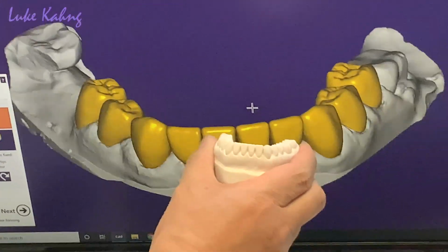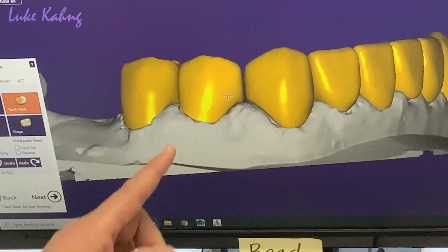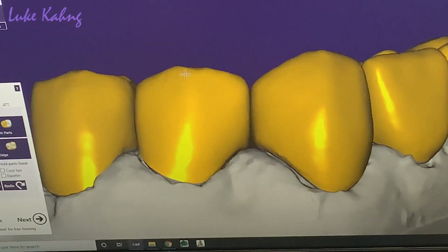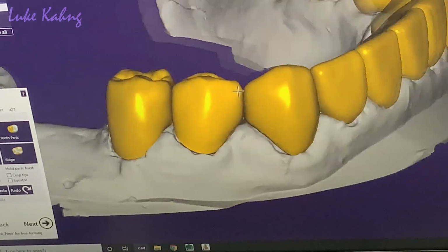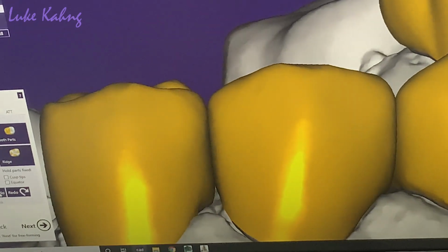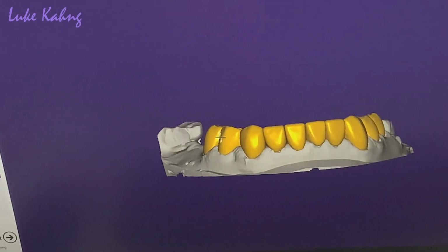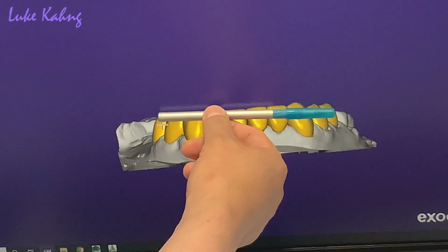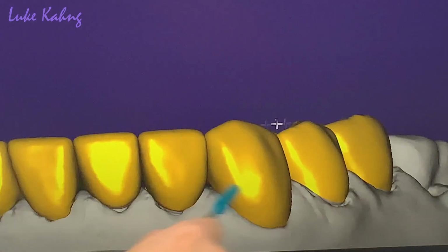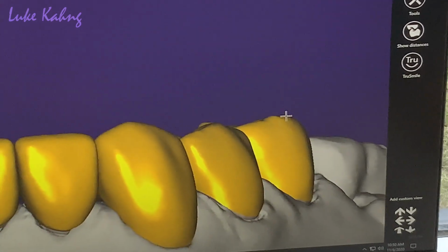But here, can you show me this? Still the margin is low. Add it. Okay, a little bit higher. Okay, this one too. No, this one is this. Yeah, okay. No, higher. All right, still lower than this. Now, what I want to set up, I want the curve lined up to this. First, bring down a little bit. Good. This one, bring down. Okay, good. Now, almost good.